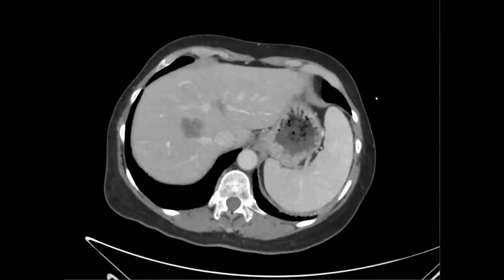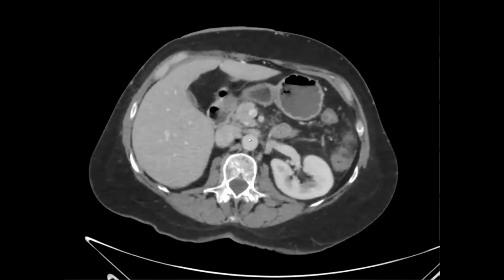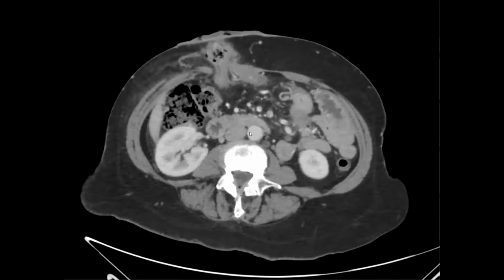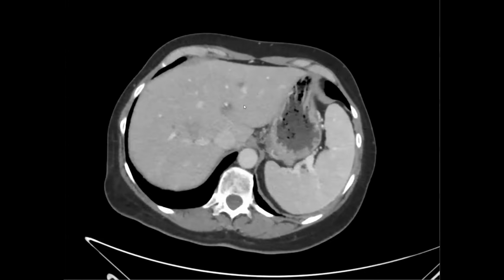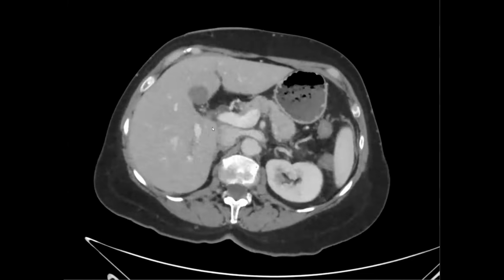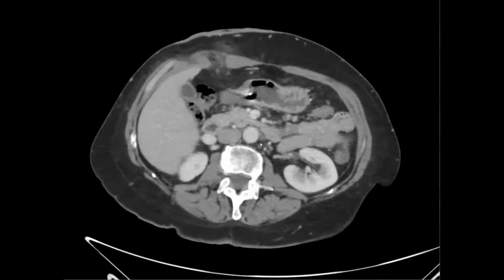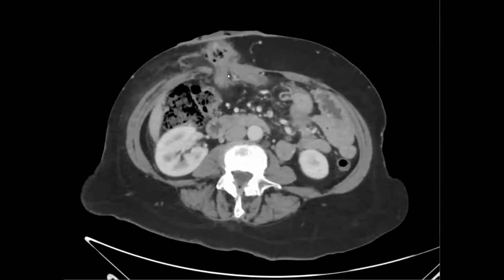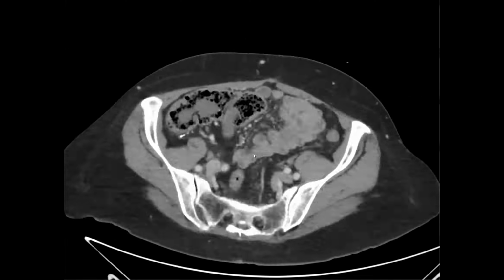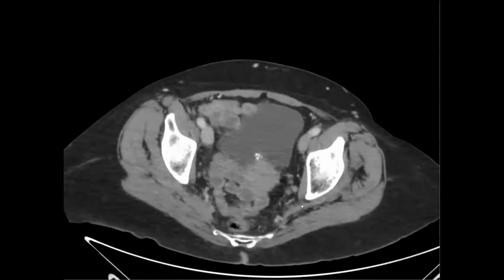Okay, so this is a patient who had colon cancer with liver mets. The liver is almost considered a regional site of disease, so we want to describe all of the liver mets carefully so that they can see if they could potentially do partial hepatectomy and ablate some of the other ones, because if they clear the liver of tumor, it could be a complete response. So this patient had a diverting colostomy because they had a colon cancer that was resected. And this is what their pelvis looked like.